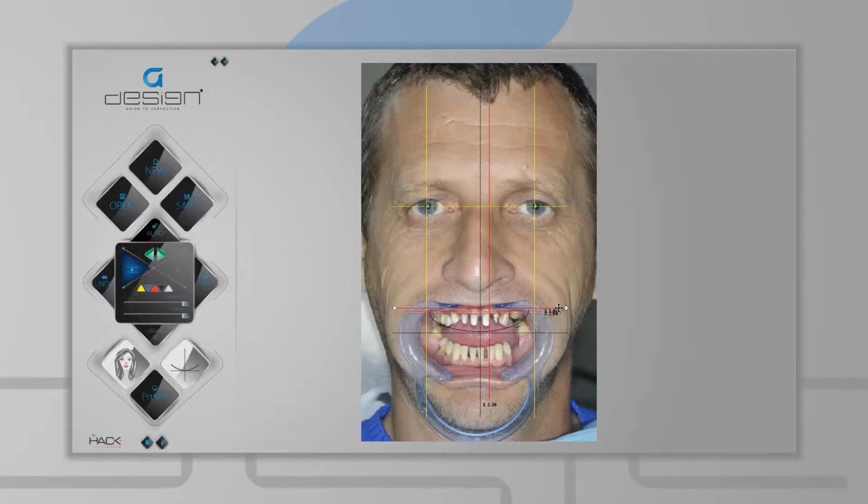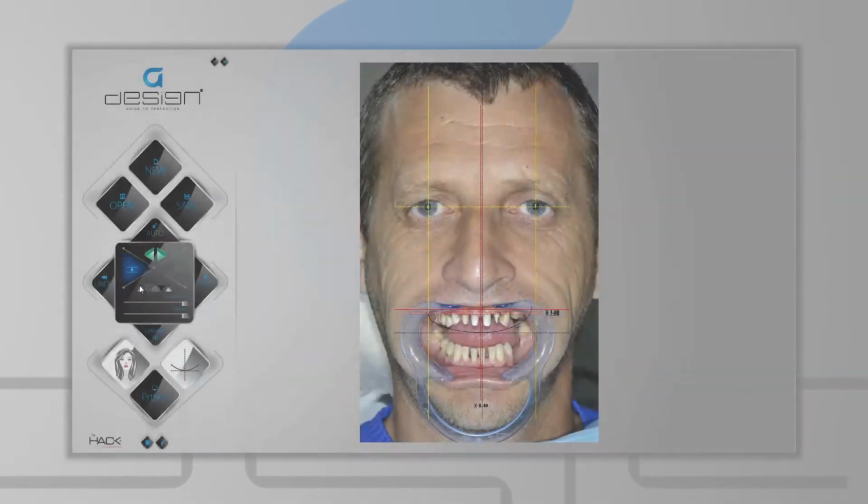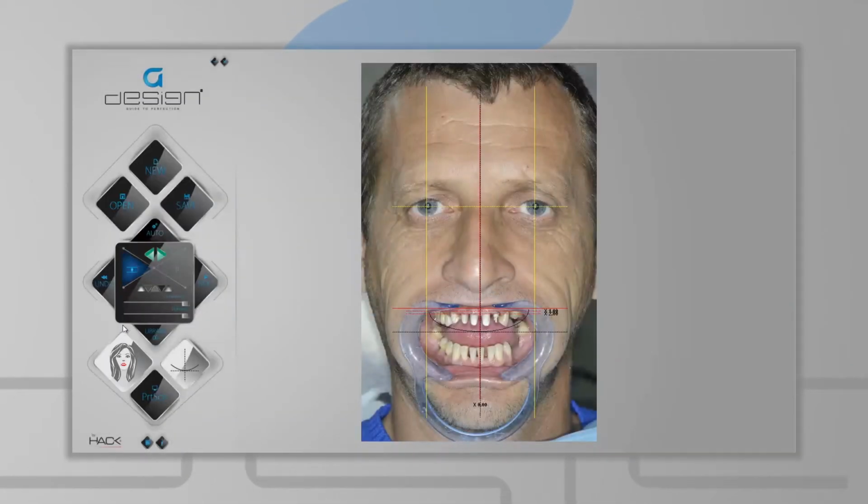If the vertical axis does not cross the midline papilla, or if a different position is desired, this can be transferred to the model by the vertical guiding line, which will be set according to a nearby reference point, the lip frenulum, the mesial edge of a tooth, etc. To hide the guiding line, press Hide or the H key. Show Ax will also hide the axes and the incisal edge. Press Show Image to hide the photo.